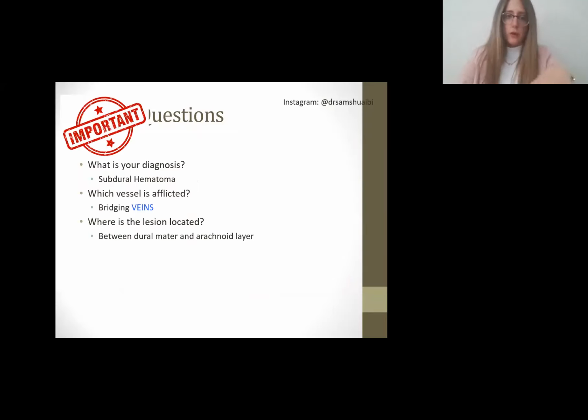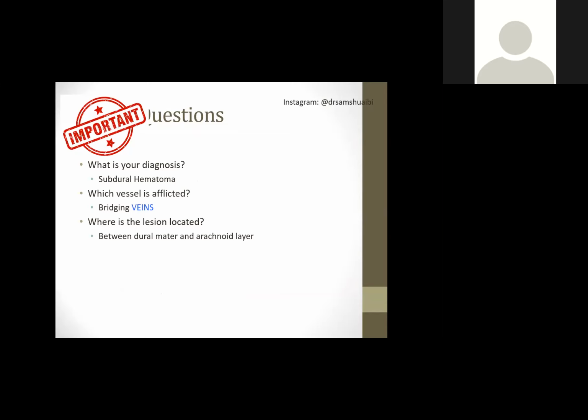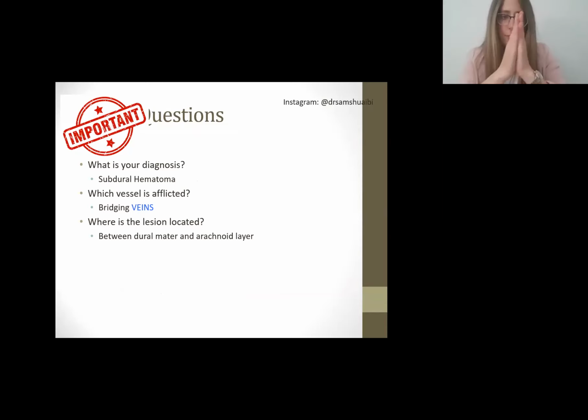Okay, so let's go with the questions. What is your diagnosis? This could be one of your OSCE questions, or it could be a question that can occur in the written exams. Highly probable. Which vessel? If I'm going to choose a jackpot question, it would be this one.